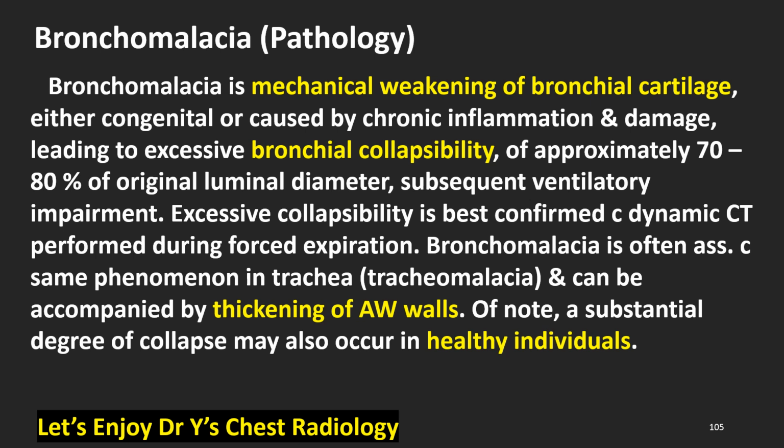Bronchomalacia pathology. Bronchomalacia is mechanical weakening of bronchial cartilage, either congenital or caused by chronic inflammation and damage, leading to excessive bronchial collapsibility of approximately 70 to 80% of original luminal diameter, with subsequent ventilatory impairment. Excessive collapsibility is best confirmed with a dynamic CT performed during forced expiration. Bronchomalacia is often associated with the same phenomenon in tracheomalacia and can be accompanied by thickening of airway walls. Of note, a substantial degree of collapse may also occur in healthy individuals.